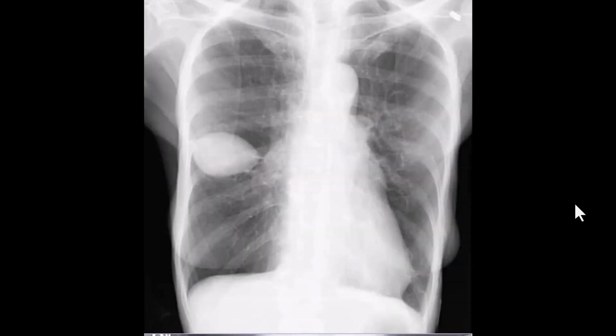Same like this one. It's like a pseudotumor sort of mass, and it's at the minor fissure in here. It's like a lemon. And usually these pseudotumors appear or occur at the fissures, and that helps to differentiate between the pseudotumors and the actual tumors of the lung.